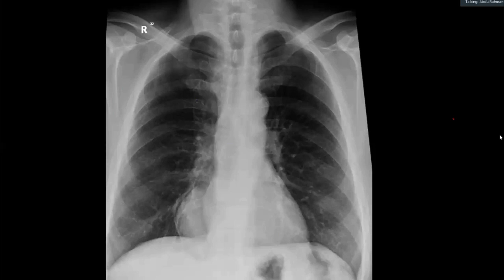So X-ray or looking at a different view. Always remember when you're showing an X-ray and you've got a differential diagnosis, you want to take this further. What would you do in the real world if you're reporting this? You would look at previous chest X-rays. You might find one from 10 years ago and it's still there, or this is something recent. So your differential diagnosis will change according to the chronicity of this finding. And obviously you would ask for any cross-sectional imaging.